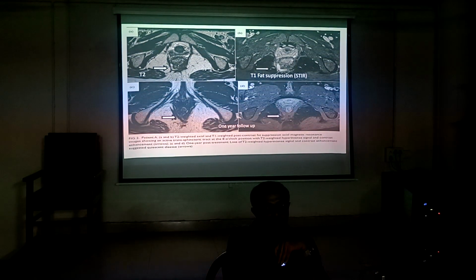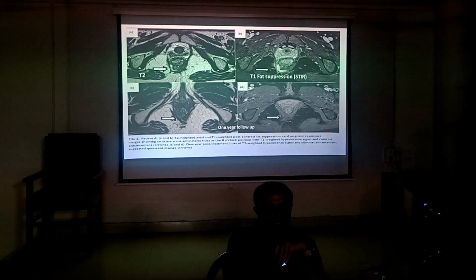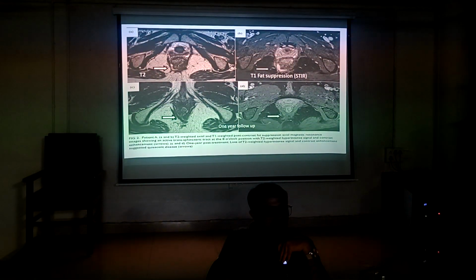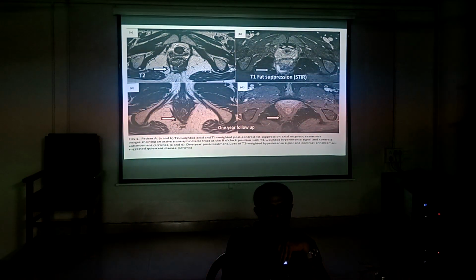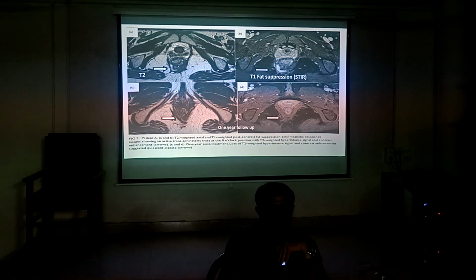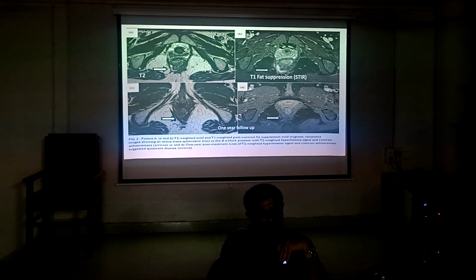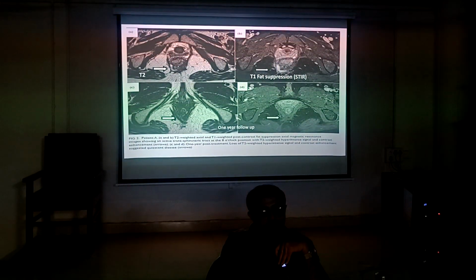Okay. So what does the arrow show in the T2 image? An inflammatory tract. There is a tract inside. The arrow passes over it. There is a white tract. Do fat suppression. So the ischiorectal fossa fat is gone. Here the fossa fat is there. Now this fat is gone. Now this tract becomes more intense. It is a fistula tract. So how can you differentiate pathology and anatomy?